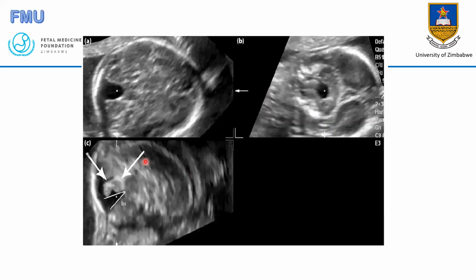Okay, unfortunately, I don't have a picture to illustrate here, but you are going to see that there's a gap. There's no enlargement of the cisterna magna space, but the two lobes of the cerebella are separate from each other. Even when you look at the sagittal plane, this is what you are going to see: a normal cisterna magna, just a slight upward displacement, but the angle is less than 45 degrees, this angle here. And this is to illustrate again, that's vermian hypoplasia.